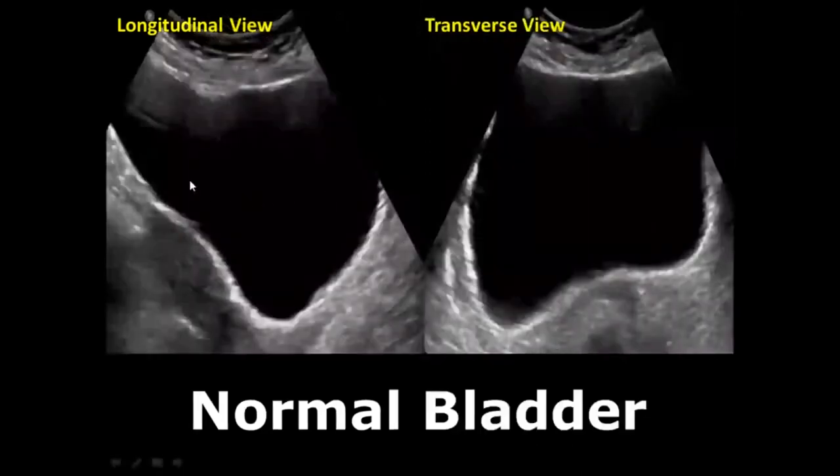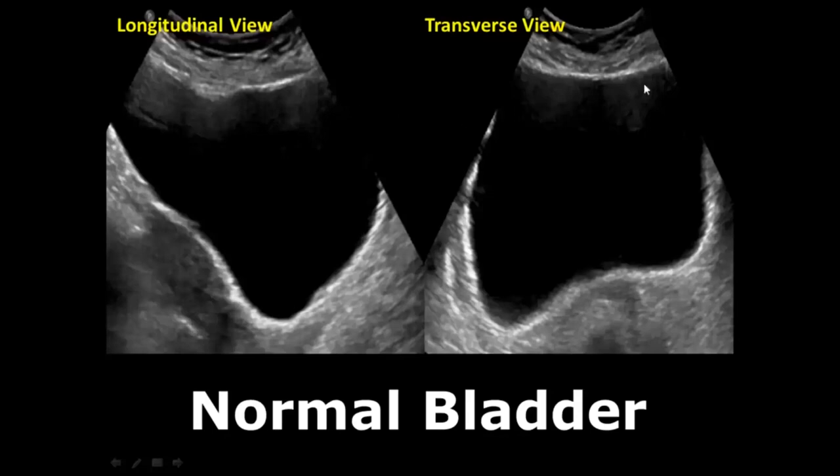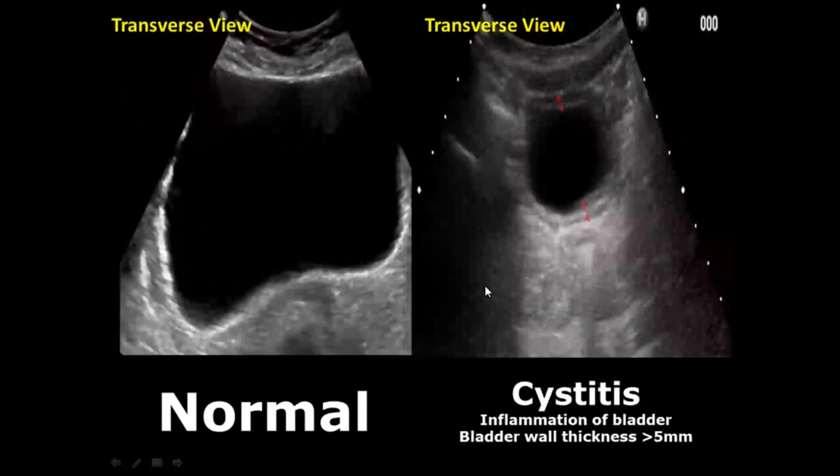These are normal views of a dilated bladder. This is the longitudinal view, and here is the transverse view of the dilated bladder. Cystitis is the inflammation of the bladder. In this image, we can notice that the bladder wall is thickened. Now, if there is cystitis, the wall thickness of the bladder must be more than 5 millimeters.